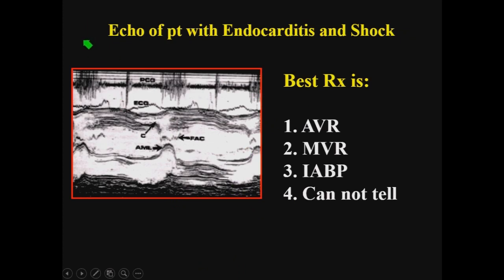This is an echo of a patient with endocarditis and shock. Again, I'm not asking you to make the diagnosis. I would ask you what is the best treatment of this patient. So the patient has endocarditis and shock.